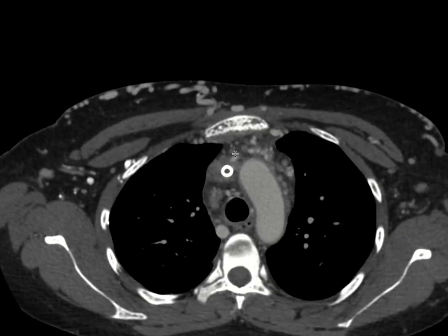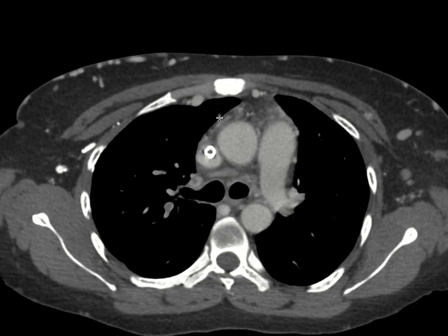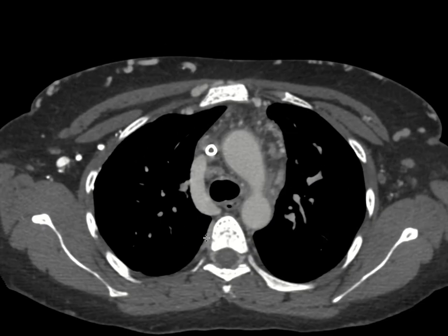Here is a patient who has chronic SVC obstruction. And so when you inject contrast through the venous system in the upper extremities, the contrast has to get back to the general circulation. And one of the ways that it can do so is by entering through the liver. And so I want to show an example of that.